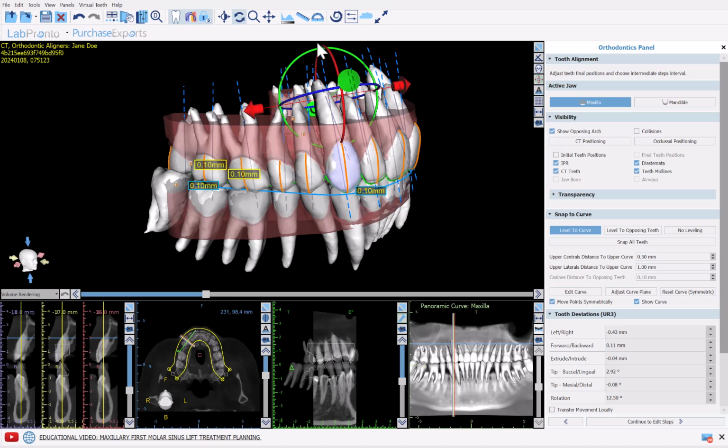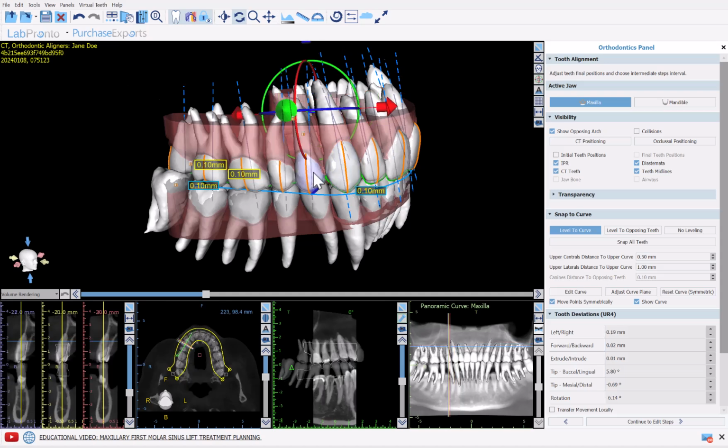Now, since the aligner digital tooth setup is being planned with full anatomical data, what we'll do is place the widget on each individual tooth based on the volume calculated for that particular tooth, so that the widget placement most accurately and correctly reflects the true biomechanics of how that tooth is going to move and the pressure the aligner is going to be applying to the tooth for that particular tooth with that particular root shape and how the tooth is going to be moving.